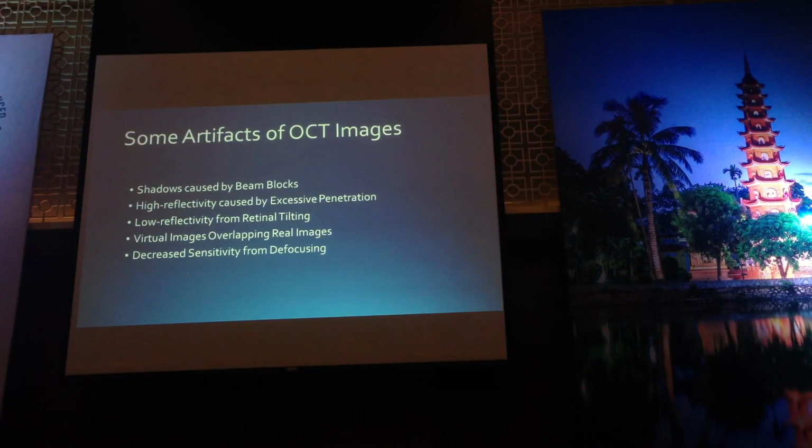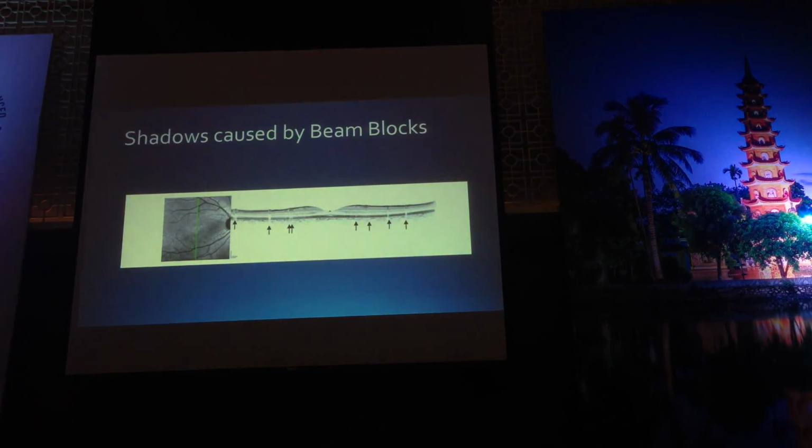These are common artifacts that you're going to encounter: shadows, and excessive penetration of the light beam. It can cause falsely high reflectivity or low reflectivity from retinal tilting, or virtual images overlapping the real images, and decreased sensitivity from defocusing. I'm going to discuss each of those.